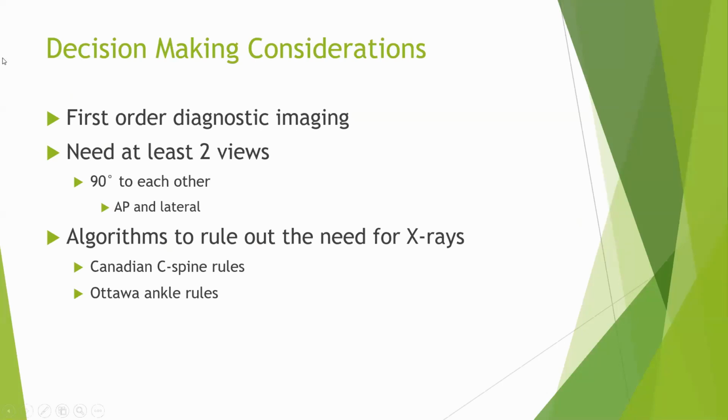But if you do need to, then you should get at least two views. The two views should be 90 degrees to each other, like an AP/PA view and a mediolateral view.